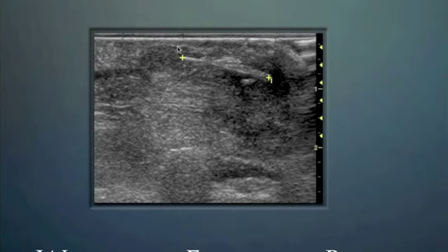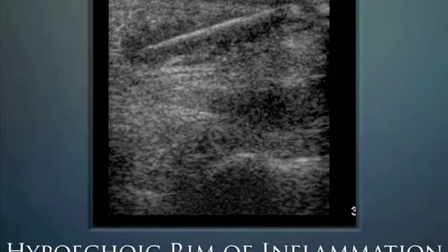And when a foreign body's been there for a while, there starts to be a buildup of inflammation. 3 to 5 days out, you can see this inflammation, or this hypoechoic rim here, around this particular woody foreign body. And this hypoechoic area also helps to visualize it.